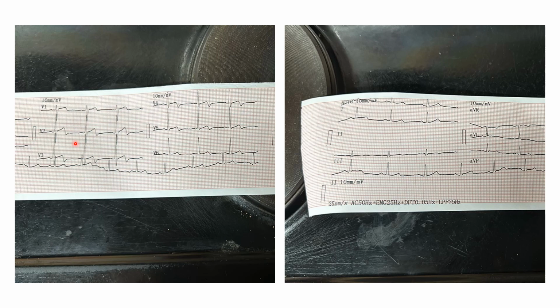Now, the main thing that I wanted to draw your attention to is what we see here in V1, V2, V3, and it extends all the way up to V4 and V5, is this biphasic T wave. We had actually discussed this just before we went on break, and for those of you who had paid attention, I think about 40 people watched the video from what I had seen on YouTube. You should be able to pick this out immediately and know what's going on. So the biphasic T wave, especially in V2 and V3, is quite indicative of Wellens sign.